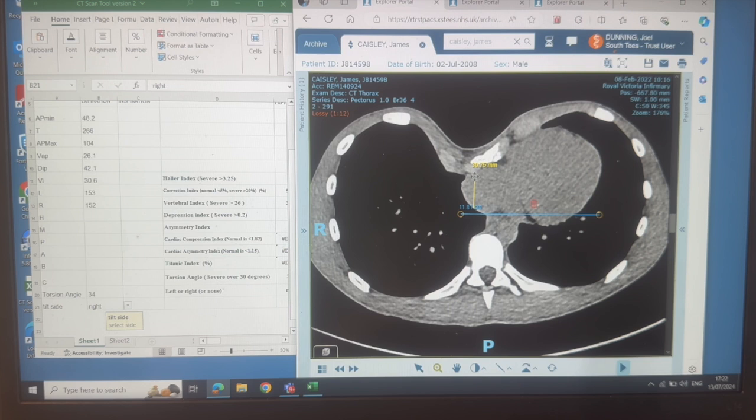So we're going to this narrowest point, got about a third of the atrium in at the least, so I wouldn't go to where there's hardly any atrium. That's where I'm going to go. He does agree that this is a little bit by eye and experience, but we need to get a decent amount of atrium, and then this is the widest point of the ventricle, all vertical.